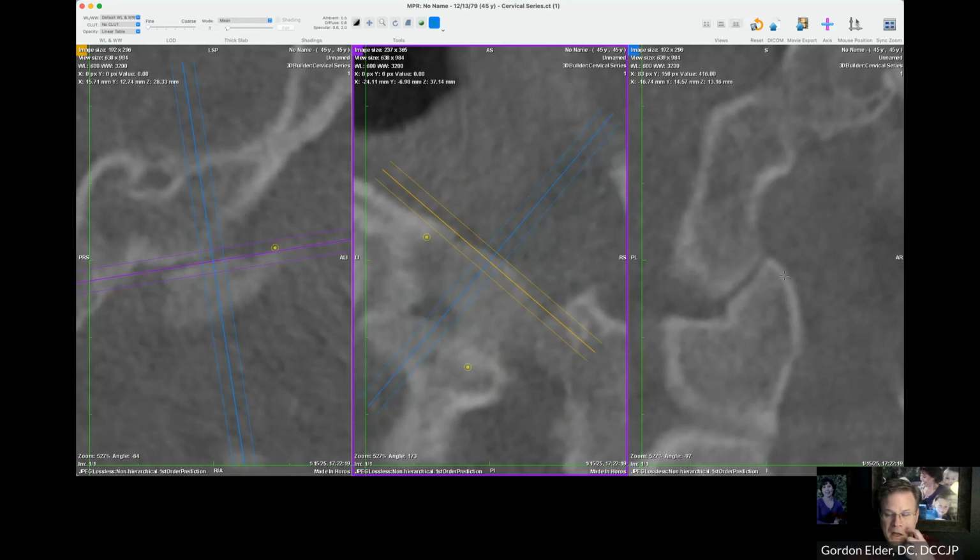And often, if it is actually lined up, it's going to look like an overlap when you go too far forward. The front of the joint is larger on the atlas, is often larger than the condyle. So it will overlap on the front bit just naturally as it's rolling back and forth underneath the skull, or the skull is rolling back and forth underneath it. That's just how the joint is made. The front is larger. So if you look at that, you're going to always think, no, you're probably just not going to be sure of what's going on there. So we don't look at that point.